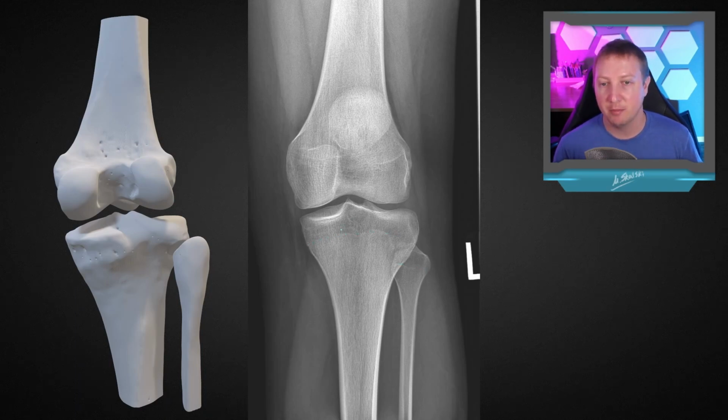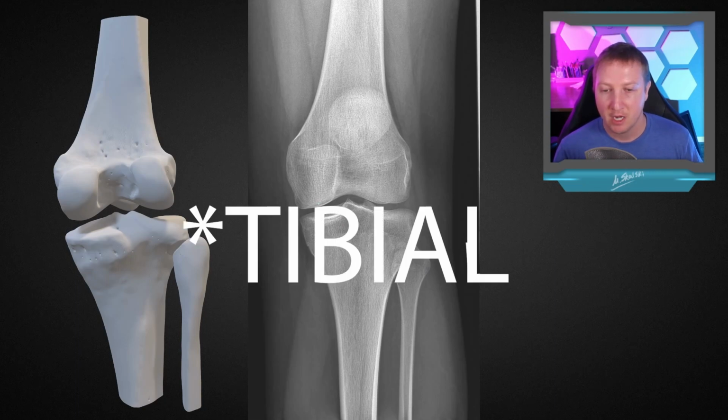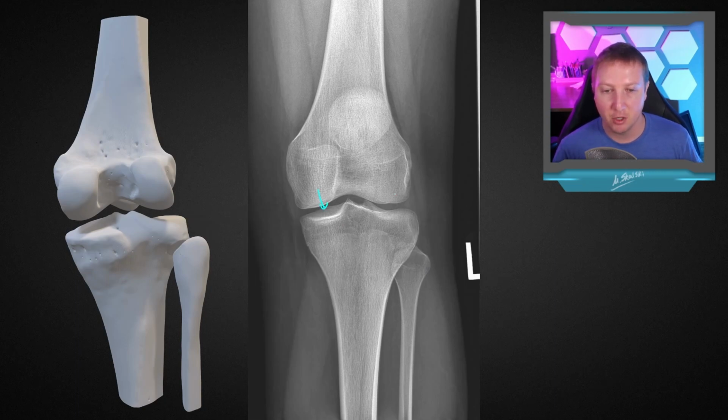And so now let's talk a little bit about our tibial anatomy. Well, we have the medial tibial plateau and the lateral tibial plateau, and so these make up the medial and lateral compartments respectively. And oftentimes you'll hear people, when they're talking about the knee, talk about the tricompartmental, because we have three compartments: the patellofemoral and then the medial and lateral compartments. And so when you want to refer to them all collectively, oftentimes it's easiest just to say tricompartmental.